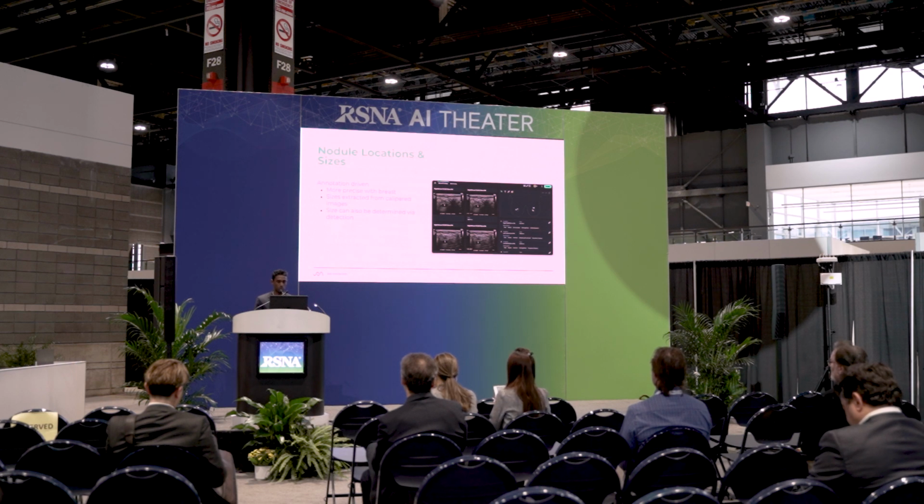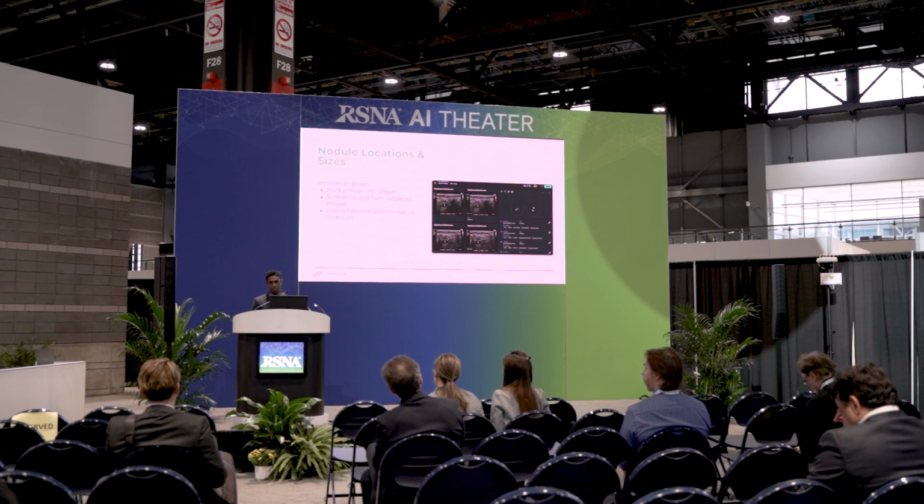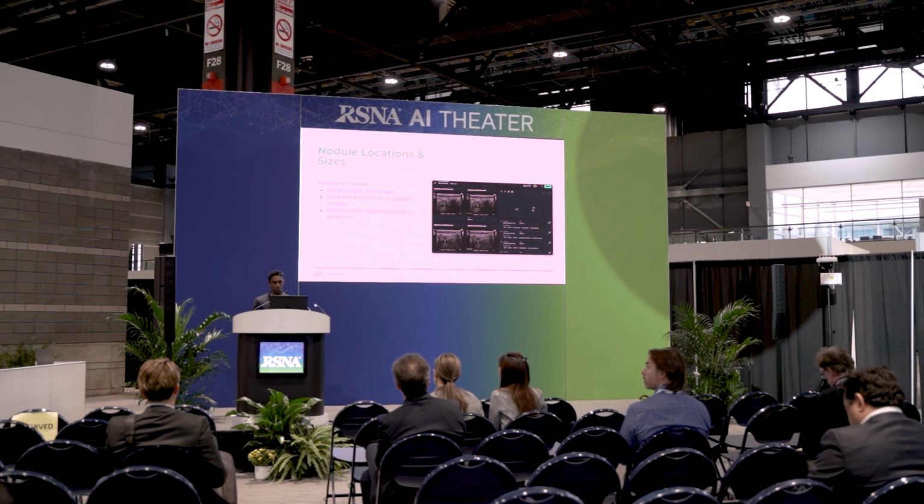And then finally, when it comes to nodule sizing and locating, which helps us position them automatically on the diagram, we essentially extract the location image off the annotation. So with breast, we can get quite precise due to the clock face system. With thyroid, we do our best with what information is present within the annotations, but then we also do allow the tech to use the interface to precisely position the lesion on the diagram as well. When it comes to sizing, we would default to extracting sizes off all of the calipered images, but we are also able to size nodules ourselves using the detection. So if clinics are open to the sizing being driven by us, that's potentially one less step for their sonographers to do when it comes to completing the scan.